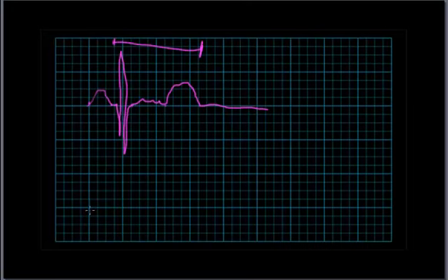That's a situation where one of the bundle branches, usually the left bundle branch, has been impaired, say by endocarditis, secondary to some sort of infection, or maybe you have coronary artery disease. There are, again, lots of things that can cause these, but we'll see that the P wave, 1, 2, just under 3, is fairly normal. But when we get to the QRS complex, in a 12 lead especially, but you can see it in multiple leads, the QRS is going to be prolonged.